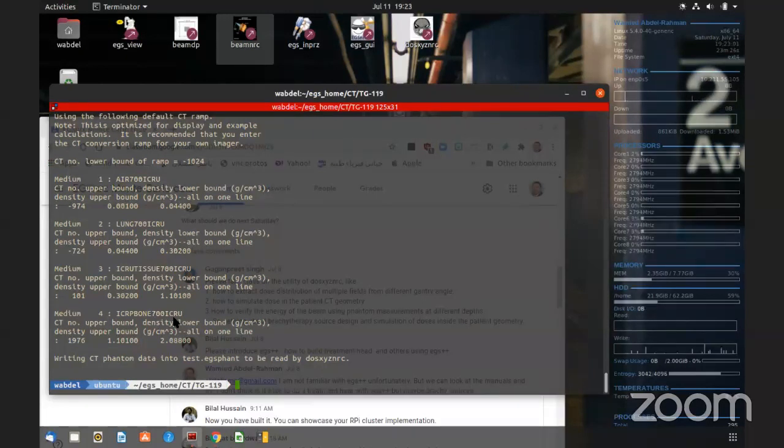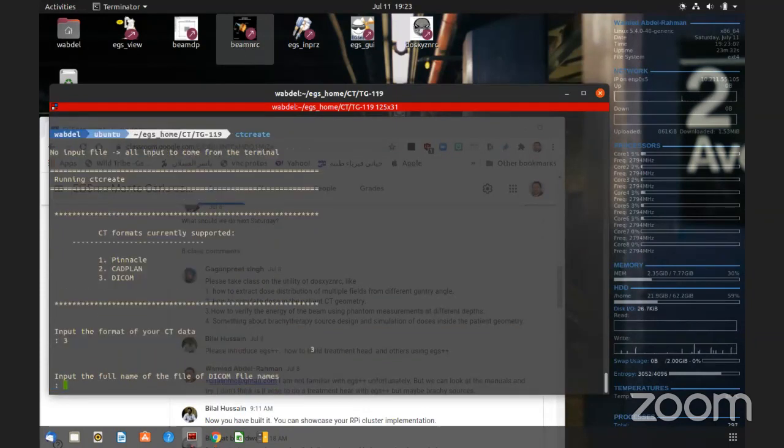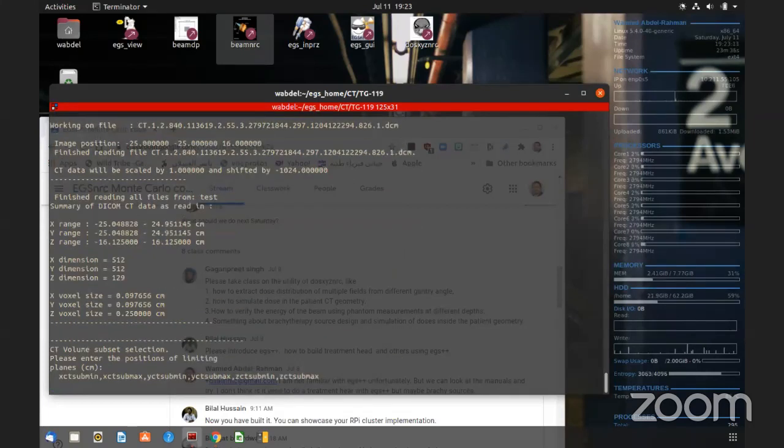So if we decided to do it manually, okay, so -25, 25. That's why I love MMCTP. It does everything automatic for me.